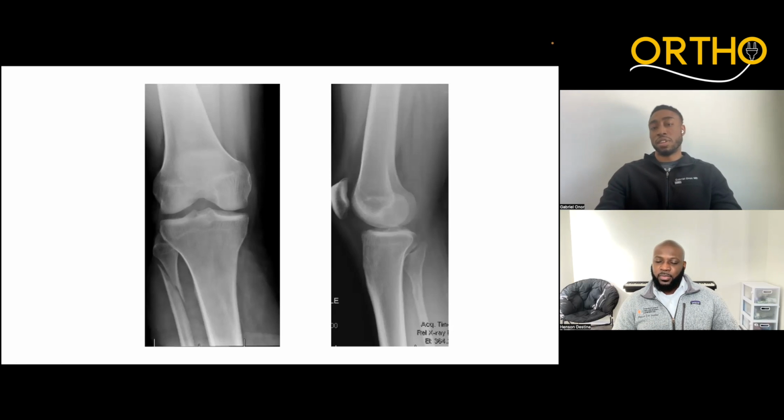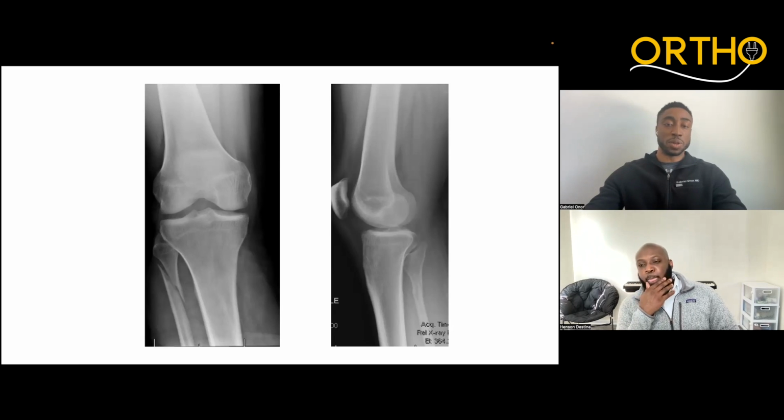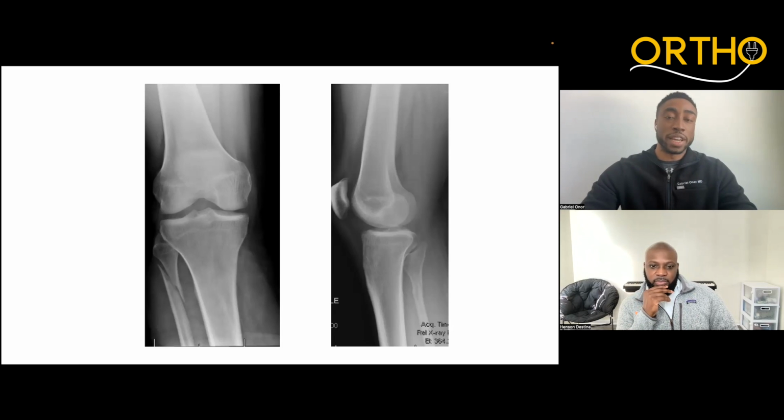But if this were around the joint, let's say this were an ankle fracture, if the ankle were dislocated, that speeds you up, because this is something I need to get to right now, rather than taking care of this other task before I go there. Just due to the potential injury to cartilage, as well as the subsequent increase in rates of arthritis. So with anything dislocated, you want to get to that a little bit quicker.